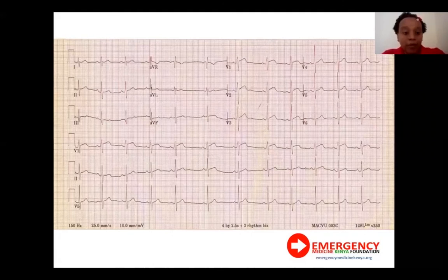So that is a rhythm that we can look at. And I want us to look at our Q waves from the strip. For this strip, you can see we have lead 2 that has a longer strip, and then the V5 that also has a long strip. Let's look at our Q waves. How do they look? Are they normal or are they abnormal?